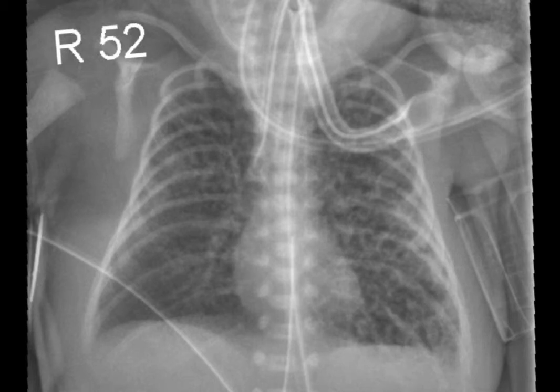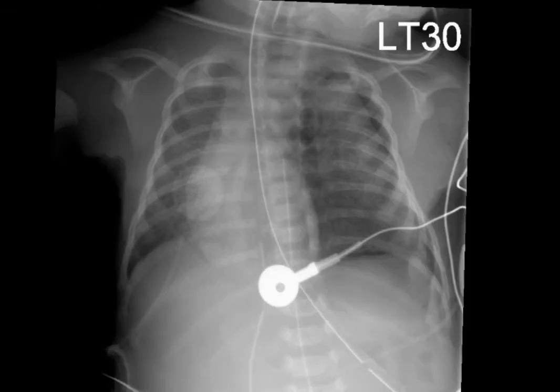This is a less severe example in that the right mid and lower lung field are spared, but you can see he's got diffuse interstitial emphysema throughout his left lung as well as in the right upper lobe. I should have apologized up front that I showed so many examples of the same thing, but if I just showed you one classic example of something, it wouldn't mean anything to you, so I like to show several different patients and the variations on a theme.